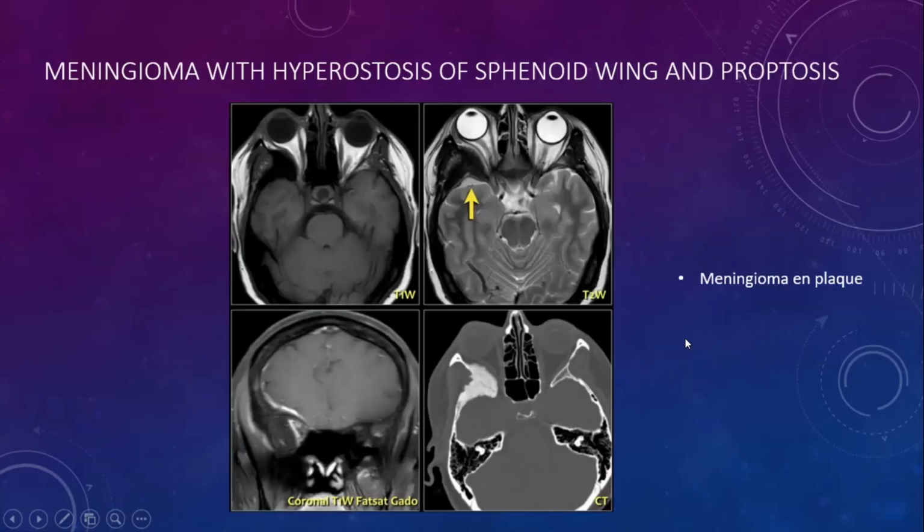So this is another case of meningioma. Previously we saw the fibrous dysplasia. Here also, in the CT imaging, sclerosis is noted. This sclerosis is because of the meningioma that is present here in the extra-axial component that is noted in the MRI in the first two images, where the bone anatomy is not clearly made out, but somehow we can raise a possibility of thickening of the bones.